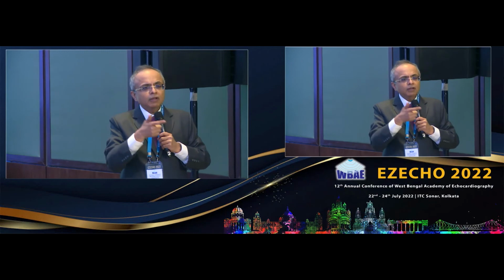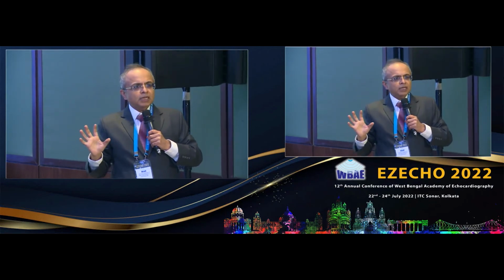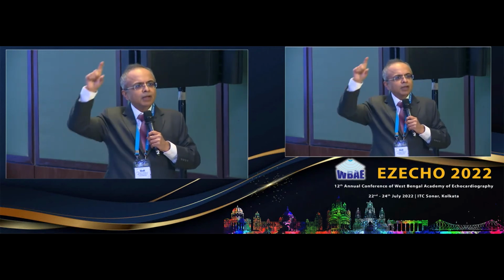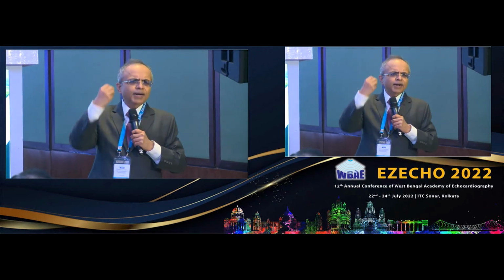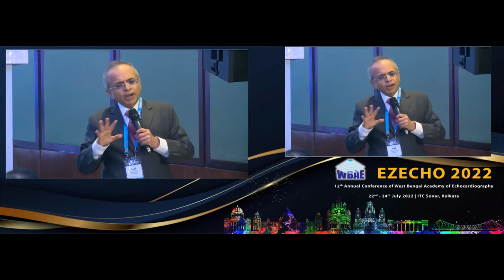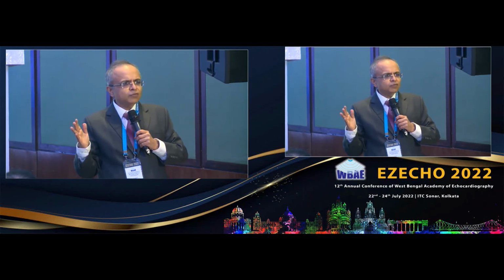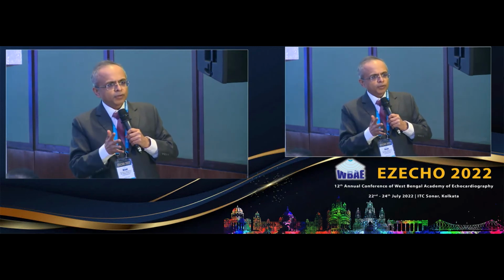That said, let me also come back that the timings of the Dopplers are very important in prosthetic valve. So in the aortic position, look at the ejection time and the acceleration time and their ratio, very important, because if the acceleration time itself goes above 100, you know that there is an obstruction, okay, nothing else, because even if it is hyperdynamic or even if it is a milder variety of PPMs, generally the acceleration times won't go so high, 100, okay. So you know that either it is a very severe PPM or it is already developing pannus or clot or whatever. So that is one thing.